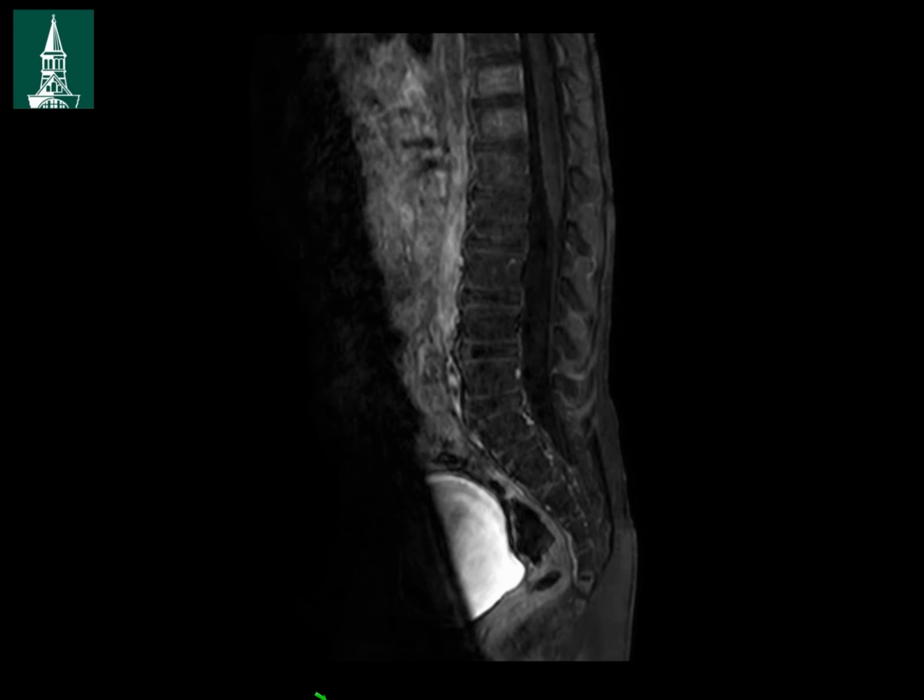And as we get towards the midline image, right about here, I think you can very clearly see this is the distal thecal sac, and there's nothing there. There are no drop mets. There's no abnormal enhancement along the conus, along the arachnoid here. And so I feel like I can be very confident with these 3D images that there are no new metastases. They're much thinner, and I think they're very sensitive to the presence of abnormal enhancement.